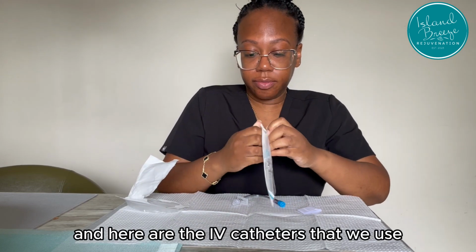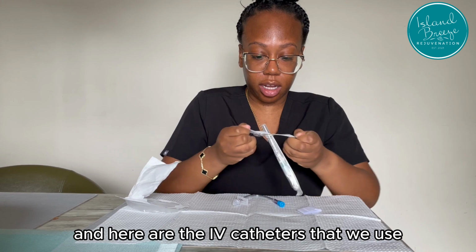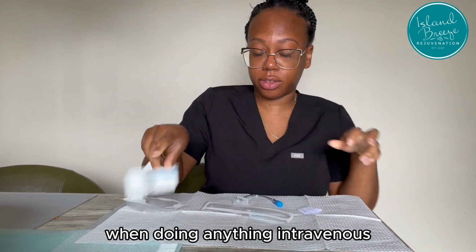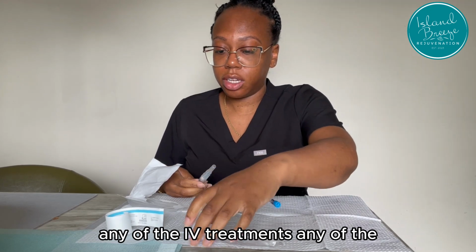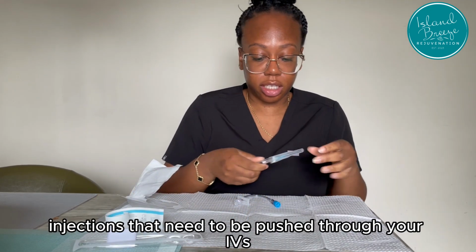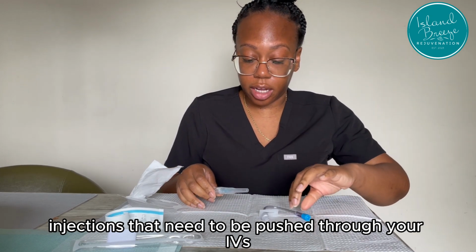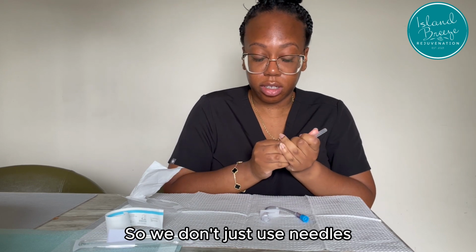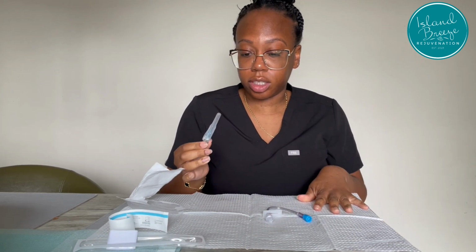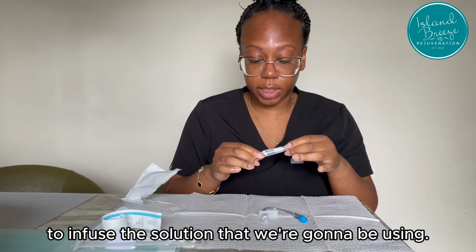And here are the IV catheters that we use when doing anything intravenous or putting through your veins. So any of the IV treatments, any of the injections that need to be pushed through your IVs, we'll be using IV catheters. So we don't just use needles to infuse the solution that we're going to be using.